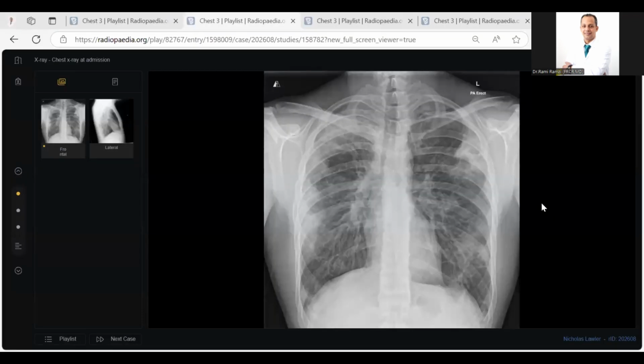Yes, I am here. A 25-year-old male patient complaining of dyspnea. I have been provided with a frontal radiograph of a 25-year-old male patient who presented with a complaint of dyspnea. Looking at the radiograph, I can see multiple peripheral based opacities in the left upper zone and also on the right side of the lung. There is a nodular opacity also noted bilaterally in the upper zone. There is interstitial prominence on both sides of the lung fields. The bilateral hila appear normal.